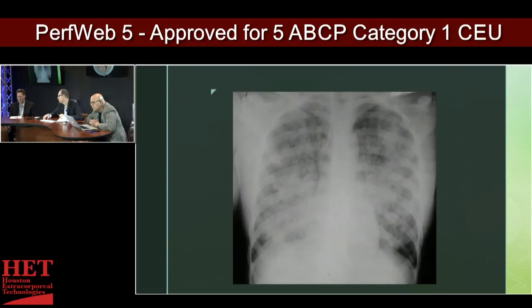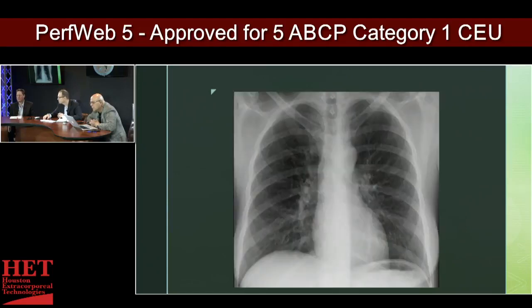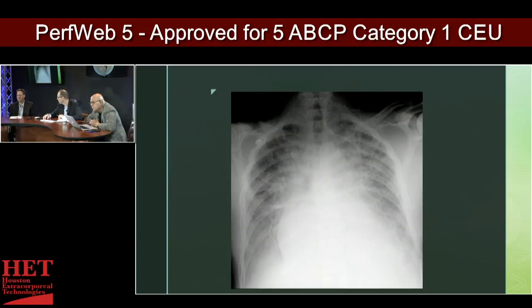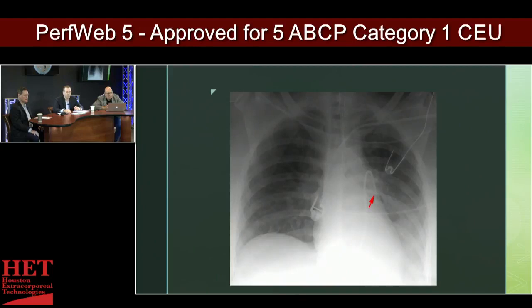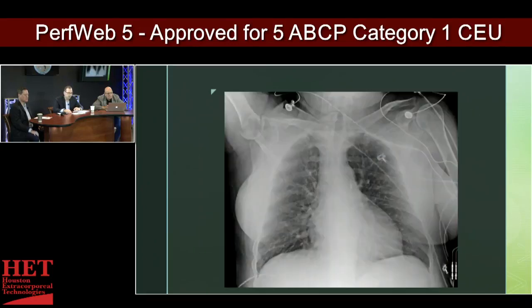Yep. You can cause the vertebral artery to go down or send thrombus if they have some atheromatous or calcific disease there. If you've just done a LIMA to LAD anastomosis on your CABG and they have a balloon pump for postcardiotomy syndrome, then obviously you could cause some damage to that graft or hinder the flow in it. So you want to have it just distal to the left subclavian artery. And in here you have the arch coming around. This is going to be the descending thoracic aorta, and you can imagine that it's going here and hugging the spine down into the abdomen. And so that vessel should be coming off right here.